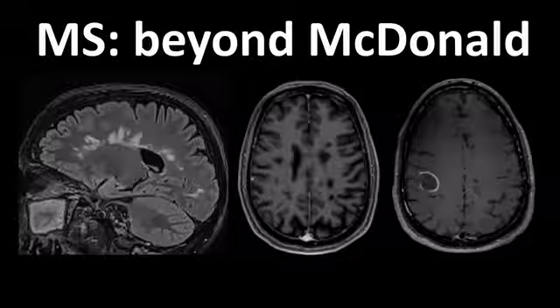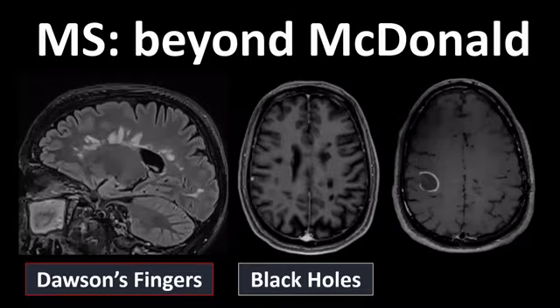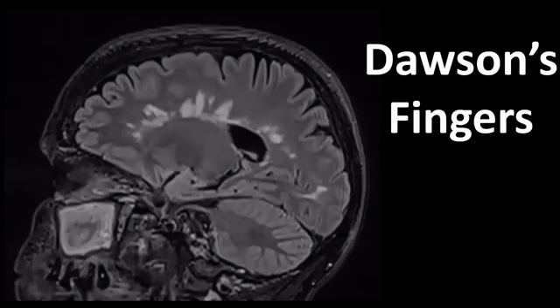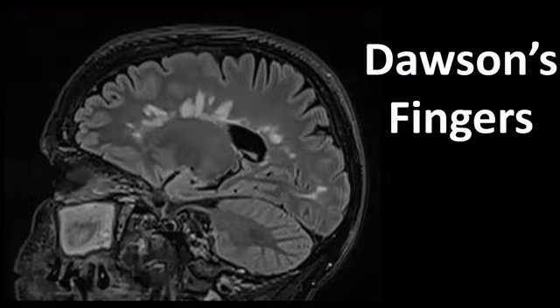And what are those? Well, first of all, the typical Dawson fingers. We have the black holes and we have the open ring or the horseshoe enhancement. Let's look at Dawson's fingers. What are Dawson's fingers? Those are periventricular white matter lesions. Now, white matter lesions are not infrequent in the general population, and we see more of them as we age. They often have a microvascular origin, especially in older patients, and they can also in older patients be located in the vicinity of the ventricles.